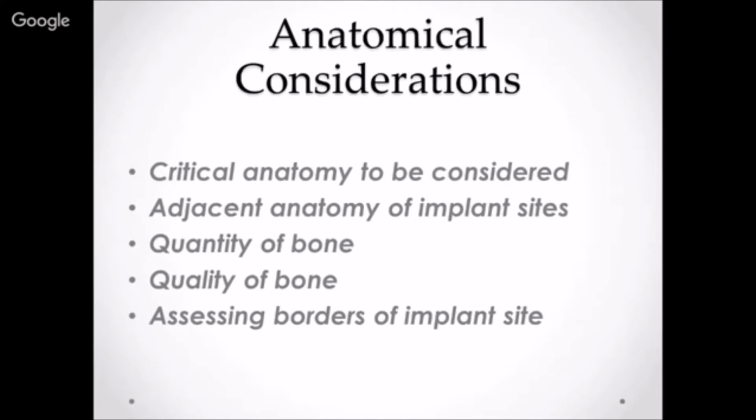Quality of bone can be assessed in multiple ways. We will be going through a few ways to look at the quality of the bone. I will give you a brief idea of how to work with it. That is also one of the most important things, since the traditional methods of measuring the quality of the bone are not relevant in 3D imaging. It is important to use a different set of standards, a different set of parameters to assess the quality of the bone.